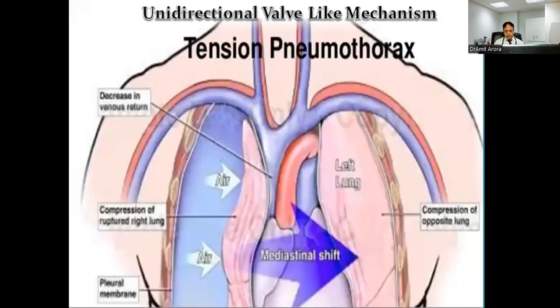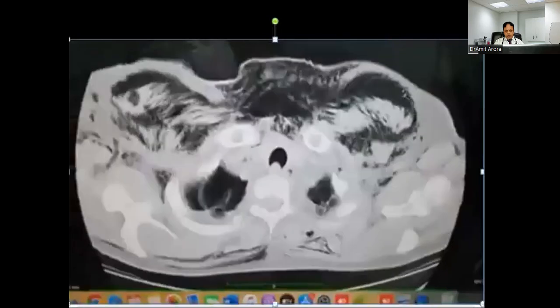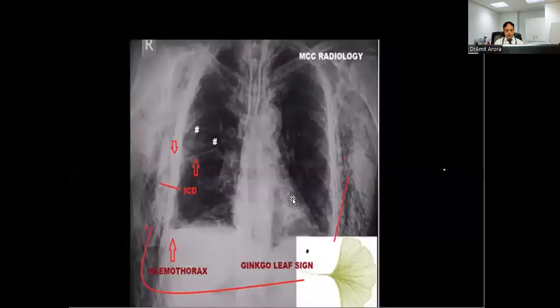So let me share one roadside accident. You might be thinking what kind of findings these are. Actually, this is subcutaneous emphysema. In chest injury, trauma or a roadside accident, you may find multiple findings, like multiple leg fractures, hydropneumothorax, subcutaneous emphysema. Subcutaneous emphysema is a collection of air beneath the skin, in the soft tissue. It gives this kind of appearance in the X-ray.